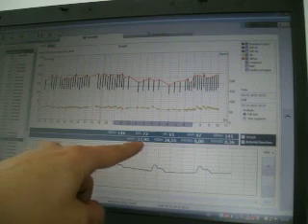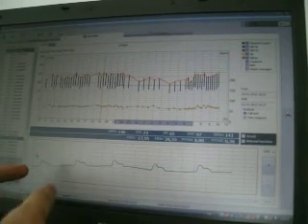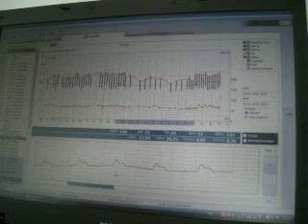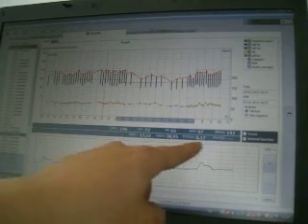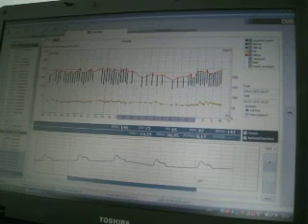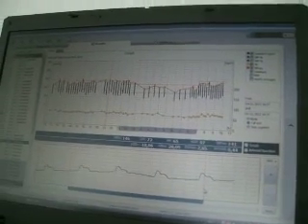If you don't like the automatically calculated results here, which is actually the average of this whole segment, you can highlight only one, and you can see that the numbers here changed, or a series of waves and receive a bit different results.